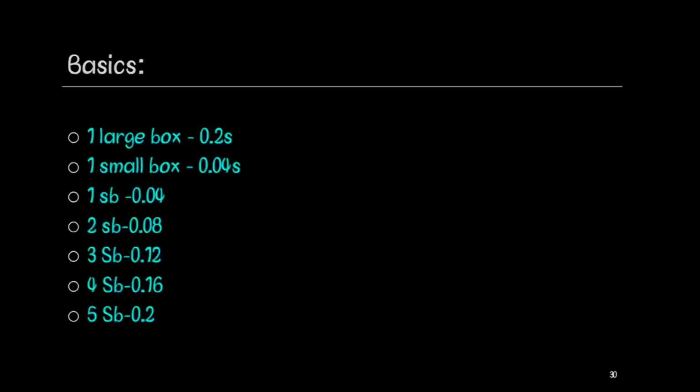second. So in a standard ECG speed of 25 millimeters per second, as you know, one large box is equal to 0.2 seconds, while one small box is equal to 0.04 seconds. So as one small box is equal to 0.04 seconds, 2 times 0.04 makes 0.08, that is 2 small boxes equal 0.08, and similarly you will multiply the different numbers of small boxes with 0.04 to get your required answer.